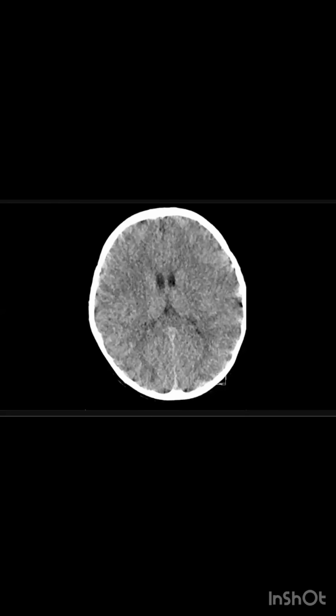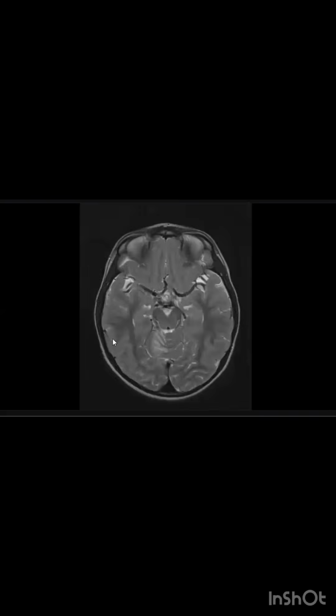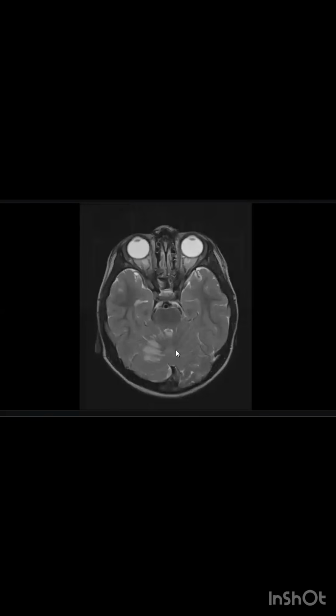We'll do MRI, okay? Like any patient with a stress fracture, like you did for the patient, the plain radiograph is normal, but the patient is in severe pain. So you have to proceed to another modality. Here in the MRI, there is hyperintense signal.